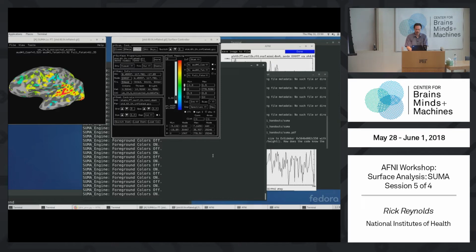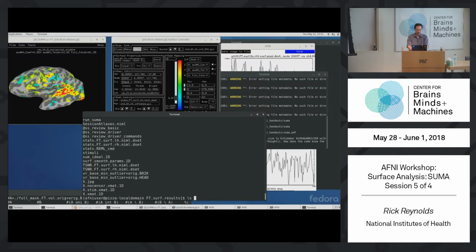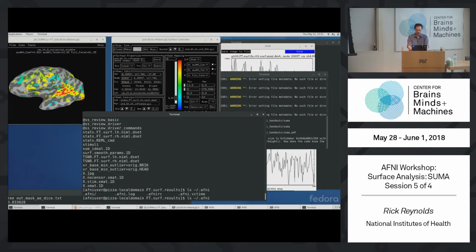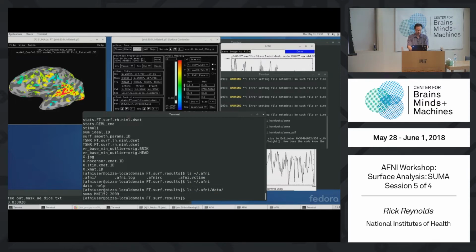Okay, so with that in mind, I want to leave this here briefly. Oh yeah, you don't even have this data. So do I have this data? AFNI data. Okay, I do have this.